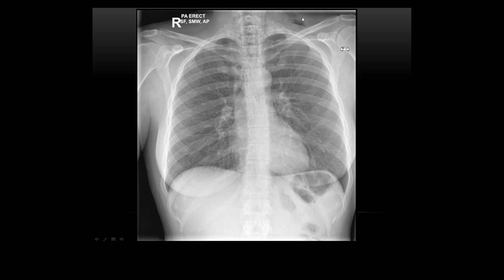So do we think there's a pneumothorax? Let's have a look at the lung markings. You can see them coming all the way out to the edge. Yes, you can't see any on this side, but the free gas on that side is confined to this region, and I can't see any pleural line. So there's no pneumothorax on that. So the next thing to look for is pneumomediastinum.